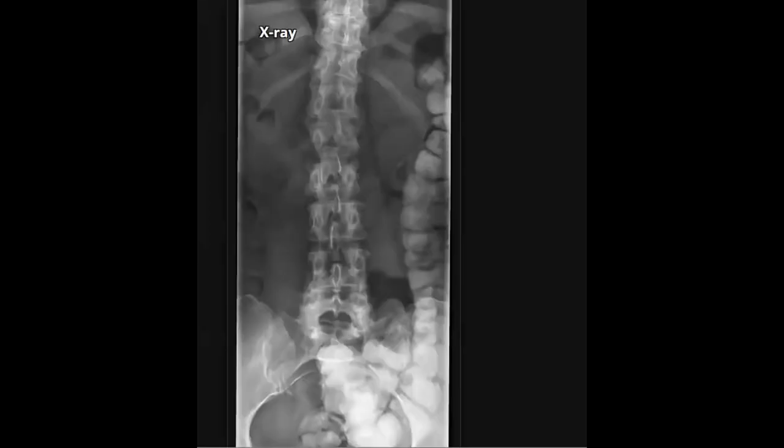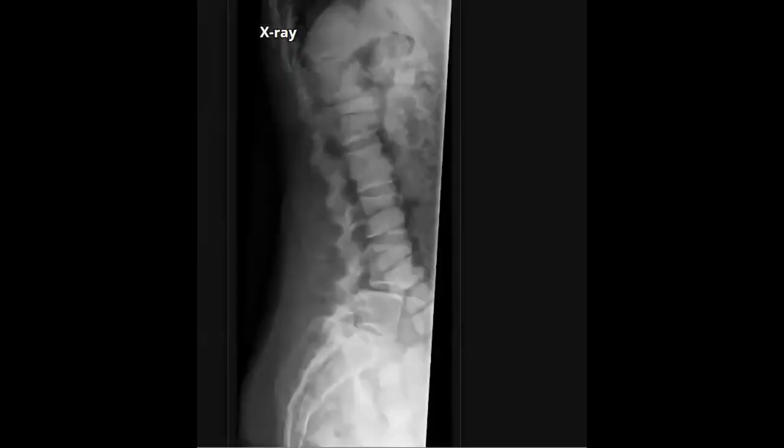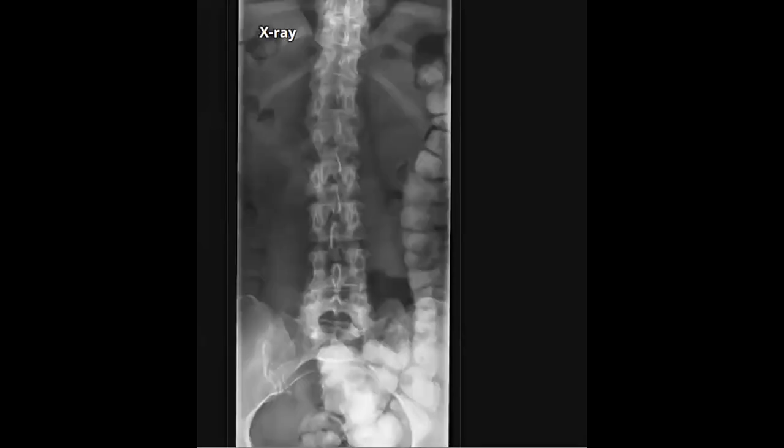Yes. Excellent. I think we exhausted you with many cases. I wish that it can be beneficial for you today. Let's end with this, inshallah, an easy case with a patient who has pain in the lumbar spine, and he did these 2 X-ray views, and there is some scoliosis. Did anyone see something here or here before we finish?